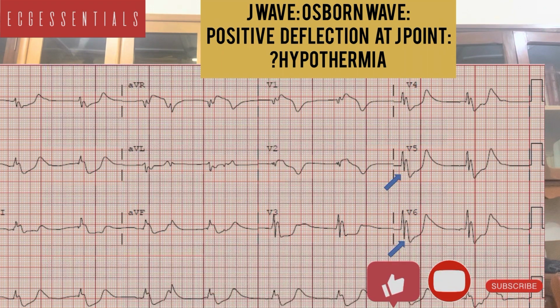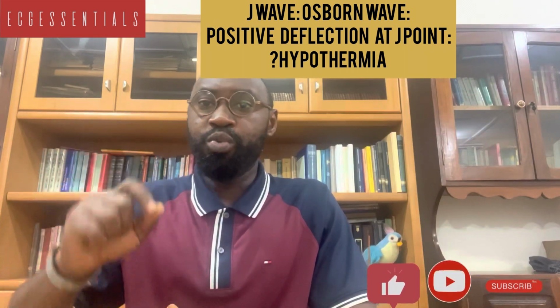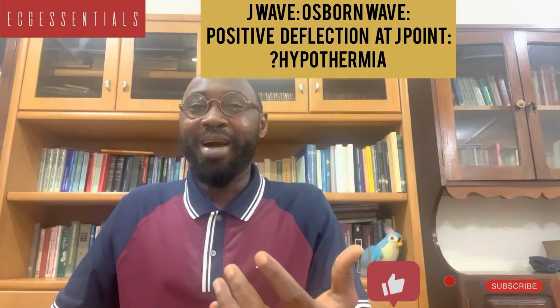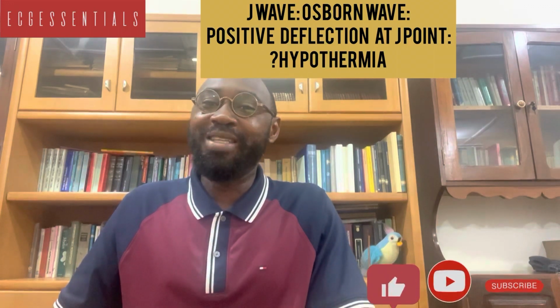a positive deflection that we find after the J point, and it's usually more commonly found in the precordial leads, and we may also find them in the limb leads. So the J wave or the Osborne wave may be significant for hypothermia. In my country, Ghana, it may be difficult to find a J wave, I think, because hypothermia is not a very common thing here.